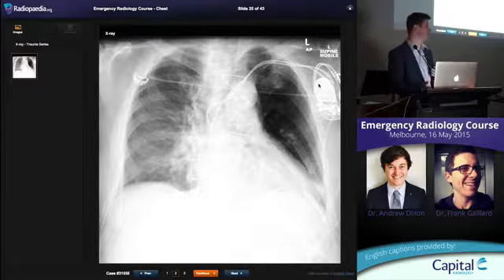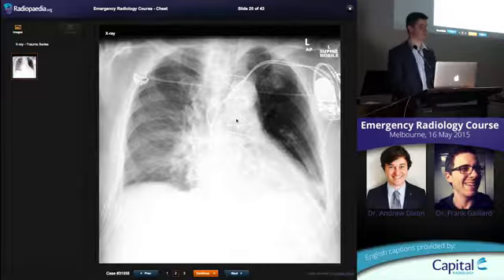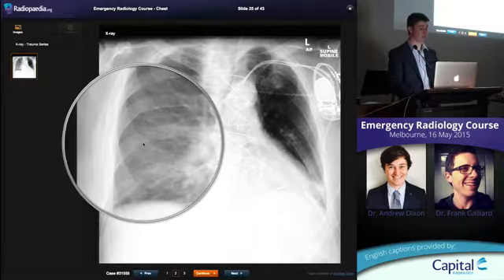It's going to be a bit like that left upper lobe collapse. You're just going to get that vague density throughout the whole of the hemithorax. When you initially look at this, you think, oh, has he got a big pneumothorax on the left, or has he got something causing opacity on the right? The answer with this patient is he fell onto the right.